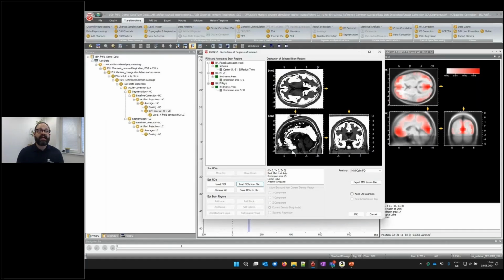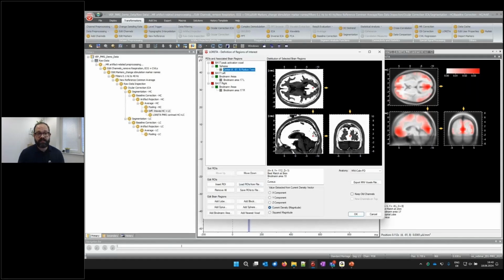Okay, again, I have used now the coordinate where we landed. You see it here, 4 minus 81, 8. This time also, that's the one that we see here, because this is inferred from the EEG data with the source model of Analyzer. So of course, the coordinate that I see here is part of the LORETA source model.